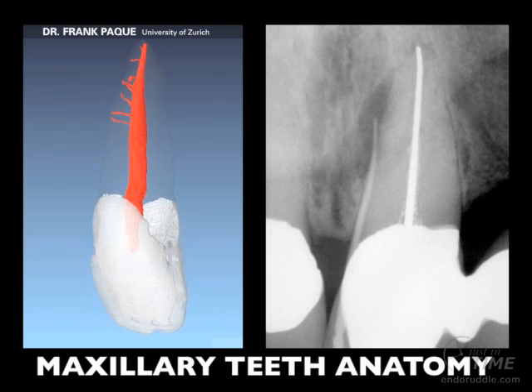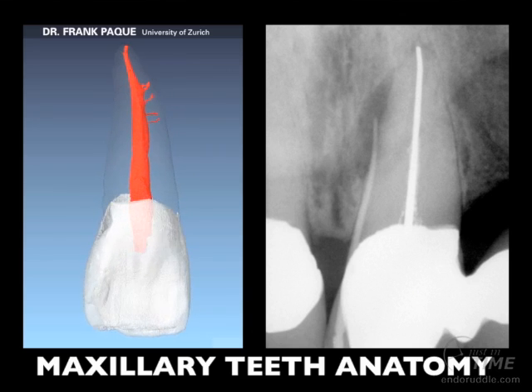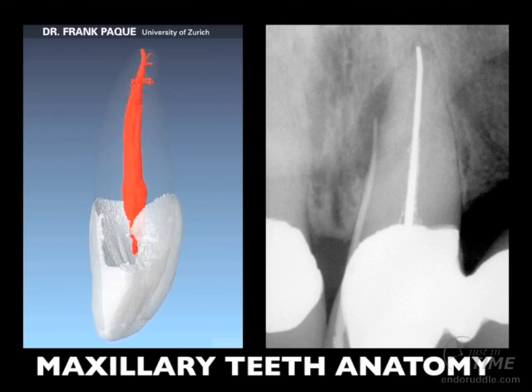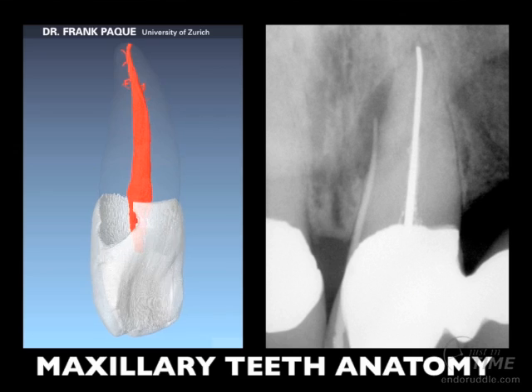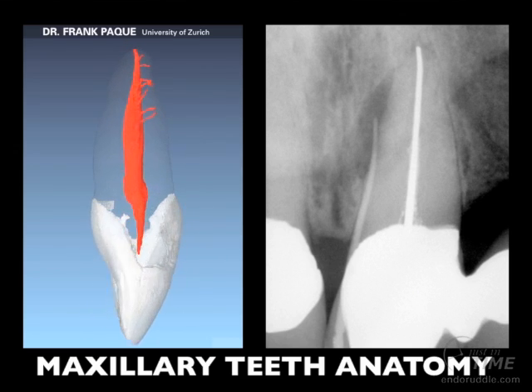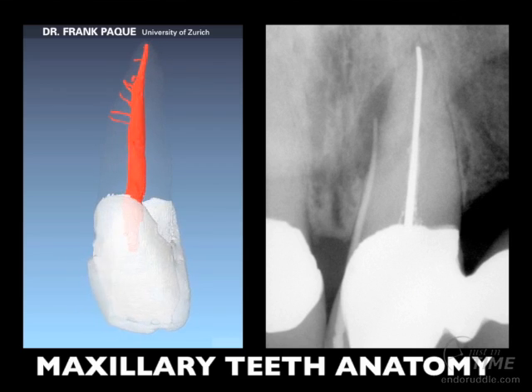Notice this preoperative film. It's an anterior bridge abutment, and it's been previously treated endodontically. Notice that there's a silver point in the canal, and you can see that there is a large diffuse mesiolateral root lesion. There was a periodontal probing defect, and there's a sinus tract that could be traced with a gutta-percha cone, and it does trace, in fact, to this lesion of endodontic origin.